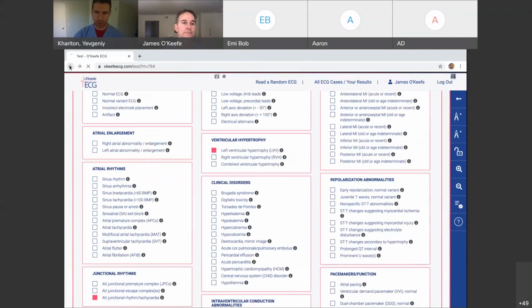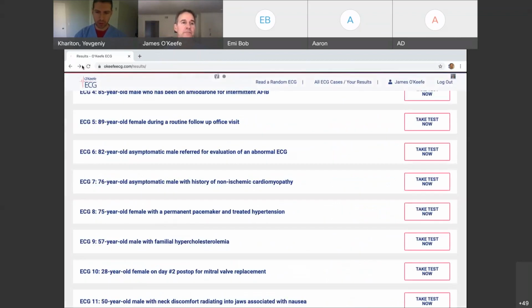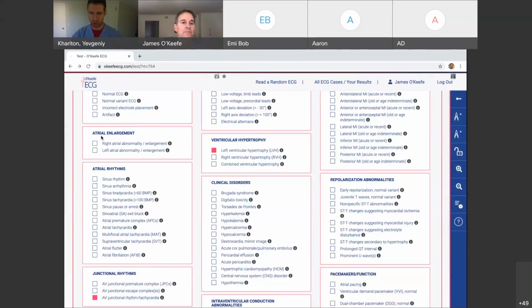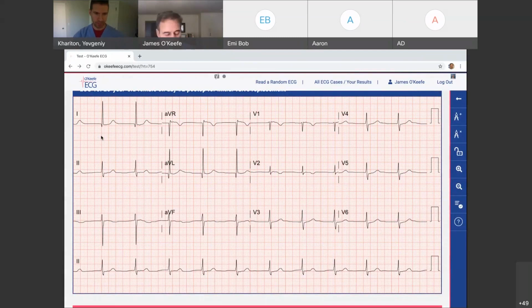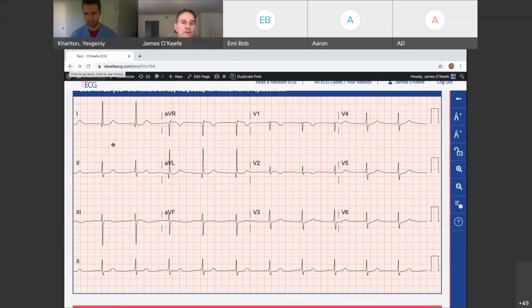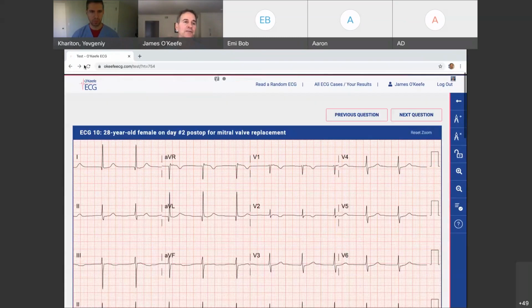There was one last question for the sake of time about whether or not to include sinus rhythm or code for sinus arrest, for instance, in the setting of a junctional rhythm morphology. Well, yeah, that's a good question. If it's a slow junctional rhythm, then you could code sinus arrest, or if you see a sinus pause, of course. But in this case, when it's an accelerated junctional rhythm, it's 65 beats per minute, so it's just overrode the sinus rate here, so you wouldn't call sinus arrest here. That's another great question. A sharp bunch on the call today here.